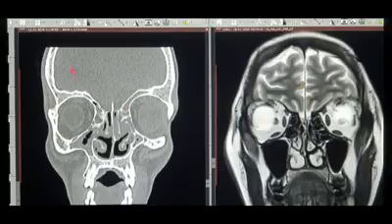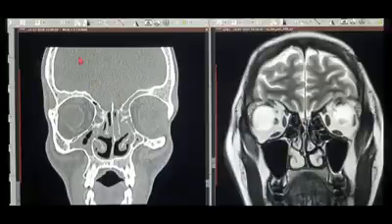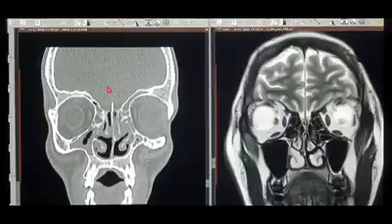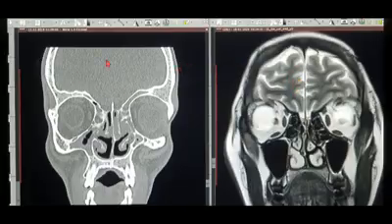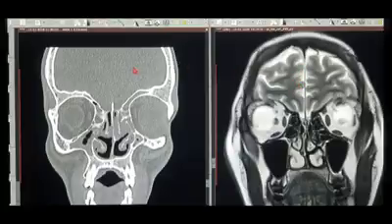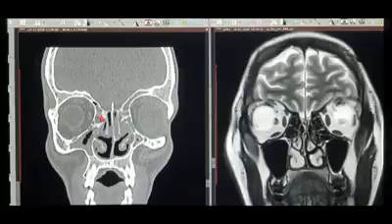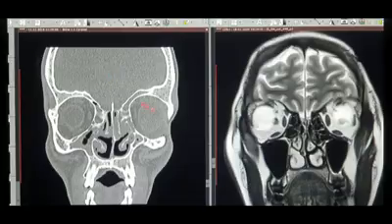So whenever you're given a scan, on a CT scan the brain soft tissue will always look like a grain of sand or uniform density soft tissue shadow, grayish. So you cannot see any sulci or gyri as you see on the MRI over here. You will never be able to differentiate between the two halves of the brain. As you can see over here, you cannot appreciate any fissure as you can see on the MRI. So basically what you can see on the CT scan is all bone, but not the soft tissue very clearly. So this was the first point of identifying if it's a CT scan or an MRI scan.